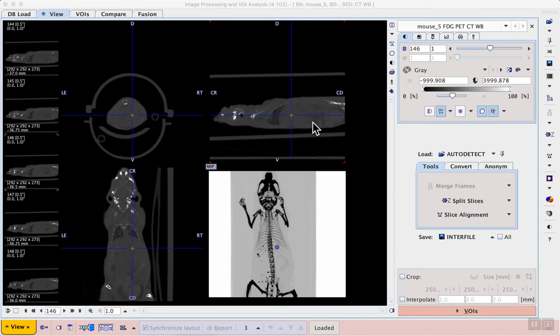So this is quite a convenient example for simple masking of the bed and the anesthesia tubing, because there is some separation between the animal and the inner bed of this cell. This could be because there was some foam padding put between the animal and the bed, but this gives us this nice separation, and then because of the cell structure, the anesthesia tubing is also separated from the animal to some degree. It can be even nicer when the reconstruction or when the bed itself was exactly parallel to the reconstructed field of view. In this case, we see that there's some sloping towards the head of the animal.